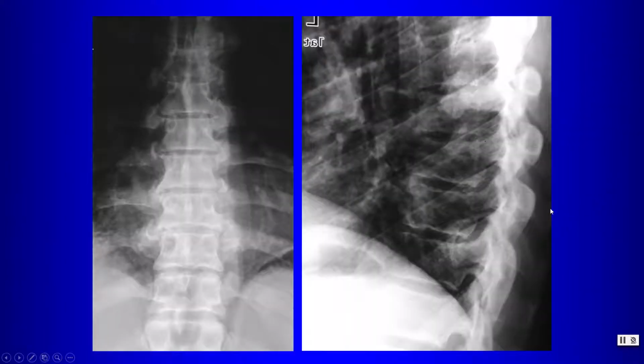Now, these are easier to see when we take bone radiographs, so these are radiographs of the thoracic spine. Here the bone detail is much better demonstrated, and it's easier to demonstrate that what we are seeing are actually osteophytes overlying the intervertebral disc spaces. And also on the frontal view, you can see these osteophytes much more easily.